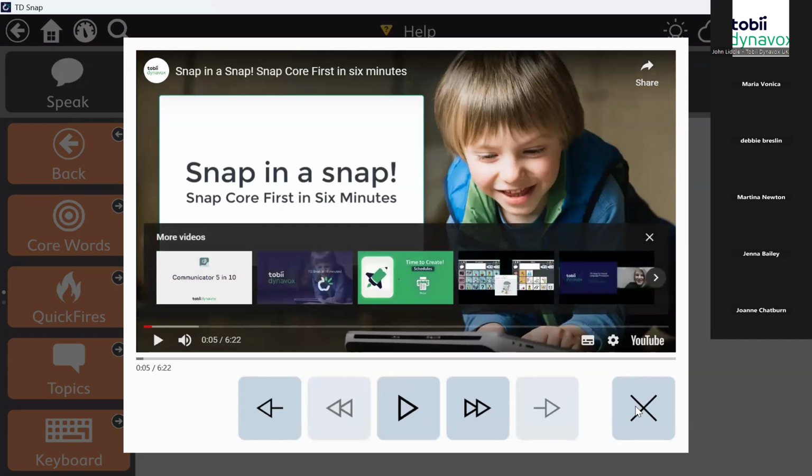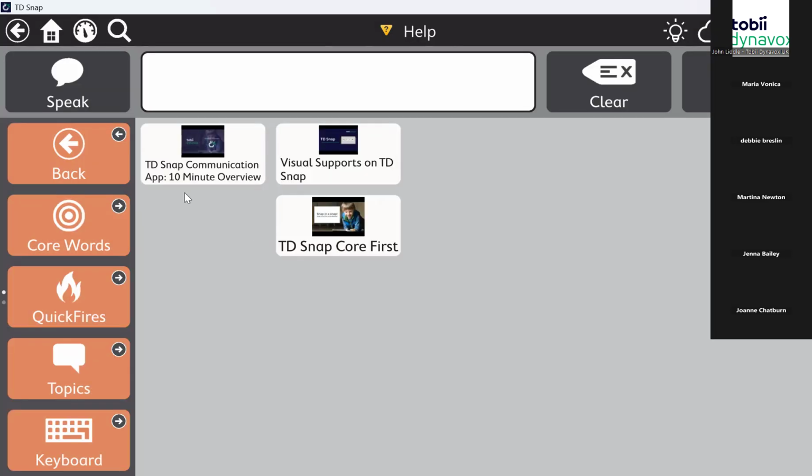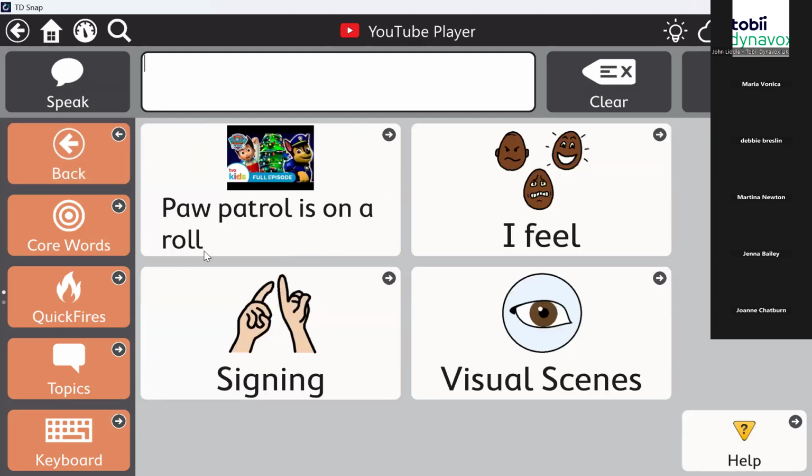It is. So again, just the ability to build in, and you can add in any support YouTube video that they might need. And then you can also title it. Obviously you can keep the title from the YouTube video directly, but you can also customize it, just make it shorter. But it just helps with navigating and to clarify a little bit for families if they don't know where to go for support in YouTube.